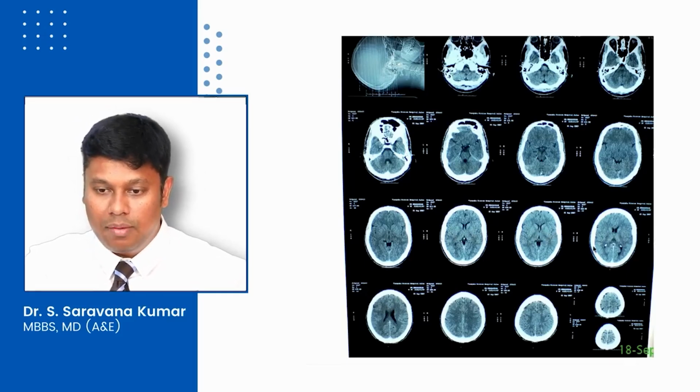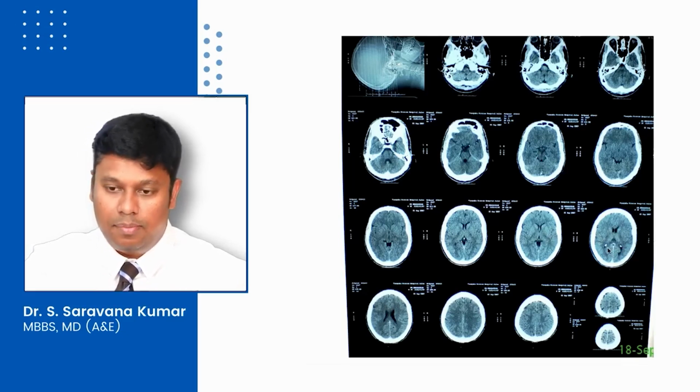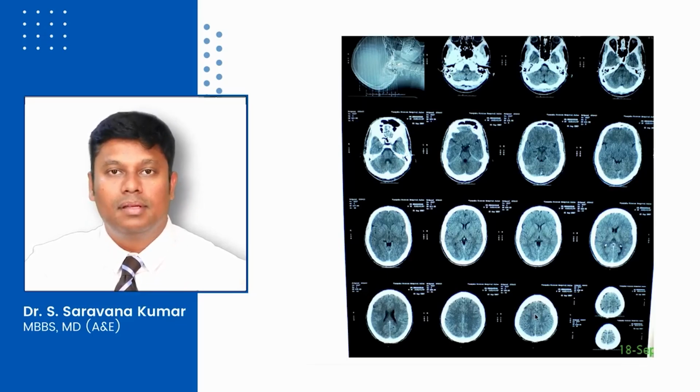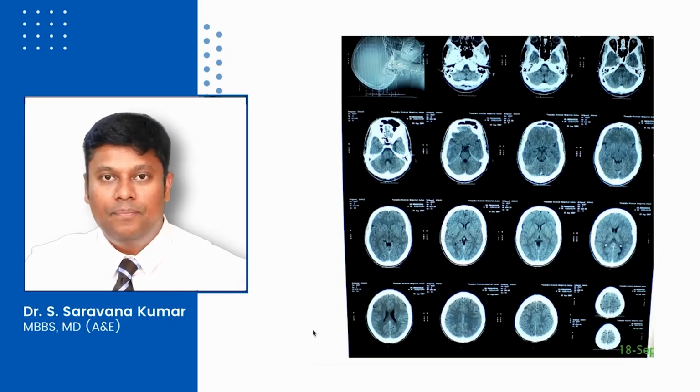And as you go into the brain proper, you will actually see the lateral ventricles, the posterior horn of the lateral ventricles. You can actually see choroid plexus, these two white structures here, cerebrum, body of lateral ventricle, cerebrum. Very easy to identify the parts if you remember the anatomy.